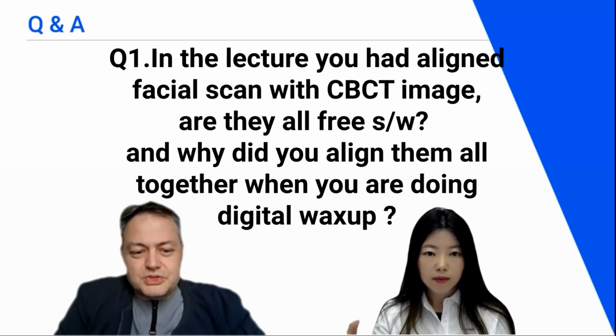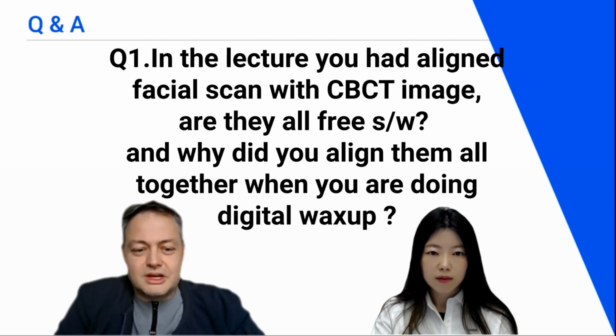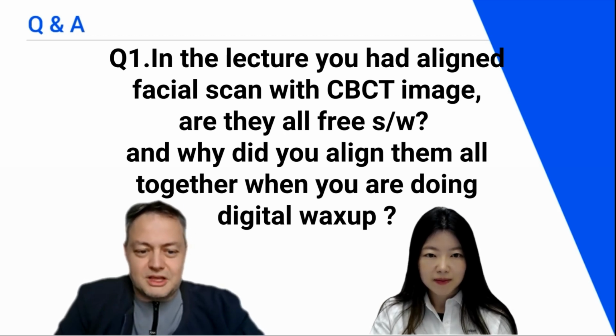And to be able to do this, you need the position of the bone beneath the actual scans, and you merge the position of the bone and the roots and everything together, and you are able to now do crown lengthenings, or to plan maybe a Zucchelli technique, and everything is going to actually integrate, and you are also knowing if you have the bone, and with some programs you even can extract the pulp chamber, and you can see how to prepare the wax up so that you are not impinging even on the pulp chamber. So everything comes together in a nice big digital patient that is very beneficial for the planning in the end.